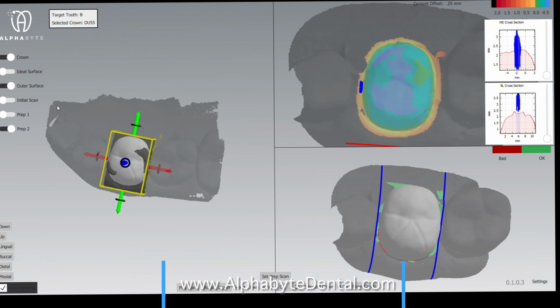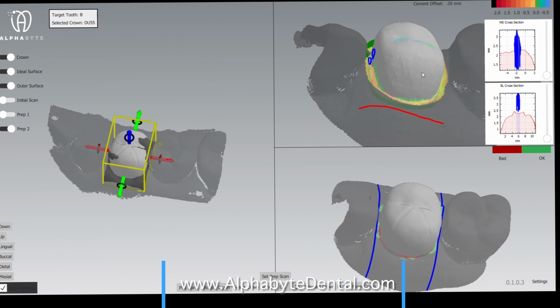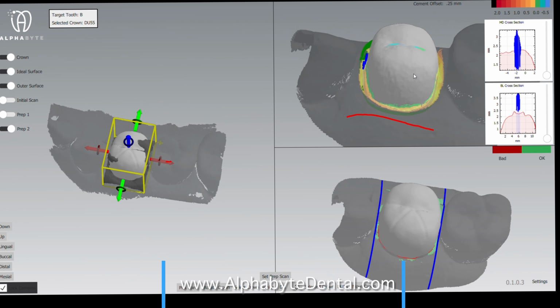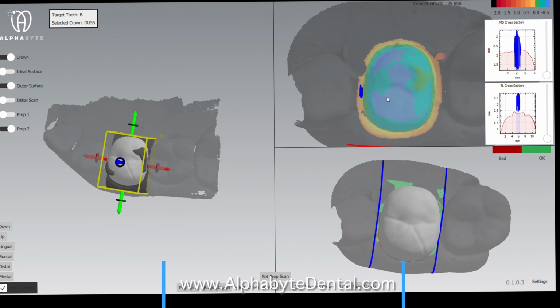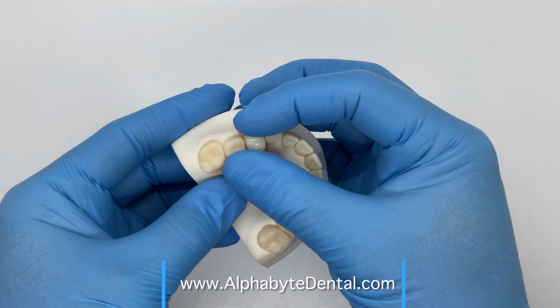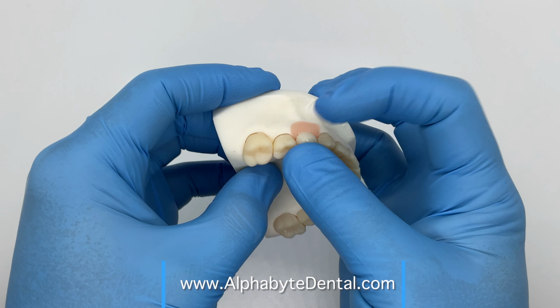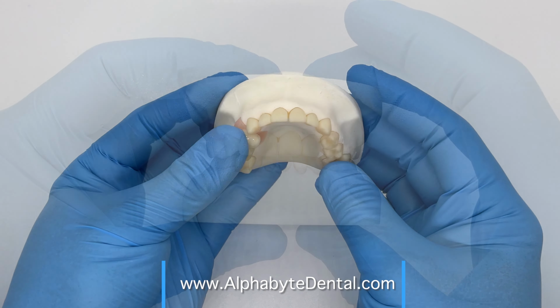with a lot more confidence that we will achieve that proper fit and good retention and resistance form by still having a mind for conservative tooth preparation, but also a mind for efficiency and proper crown placement. So seeing that this is all green and blue ensures that our crown should go into place, and in this case it does. We have an ideal crown size selection and an ideal preparation form that is still done so conservatively, and we have not had to question the initial crown size we selected for try-on the very first time.